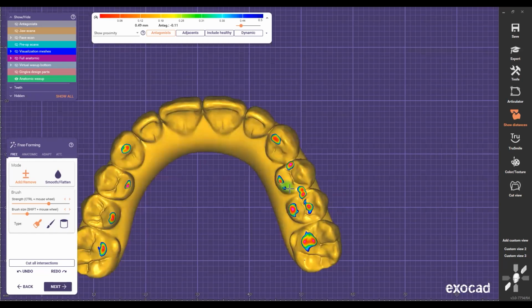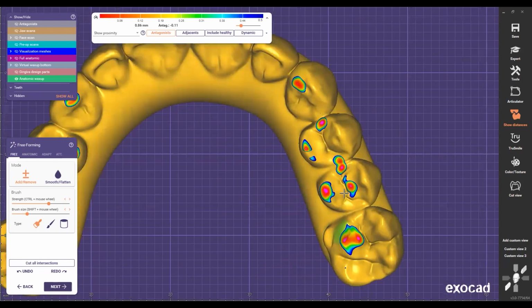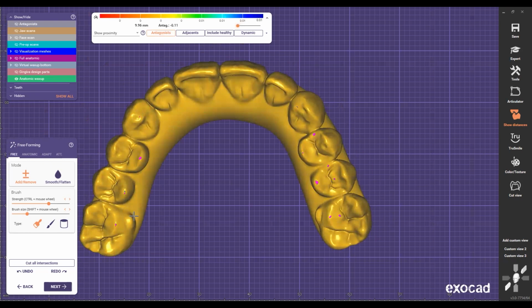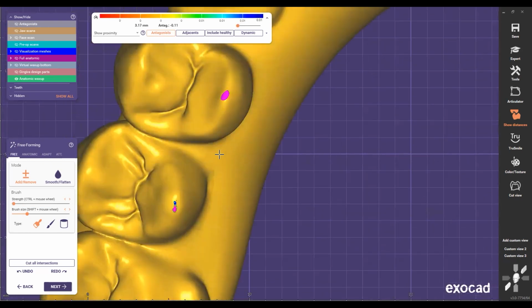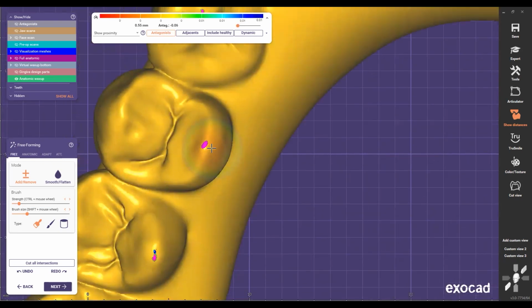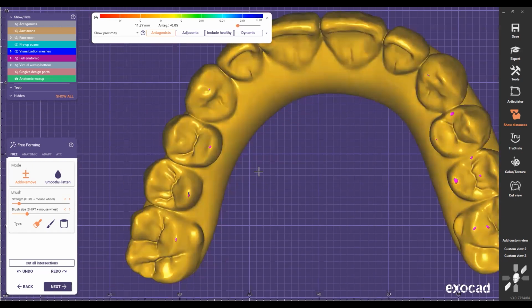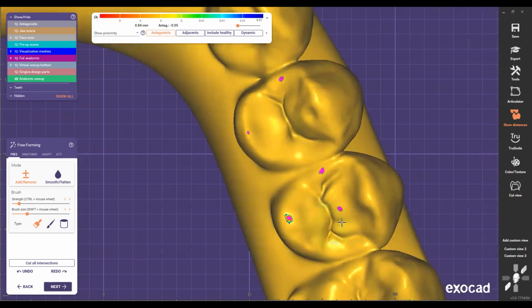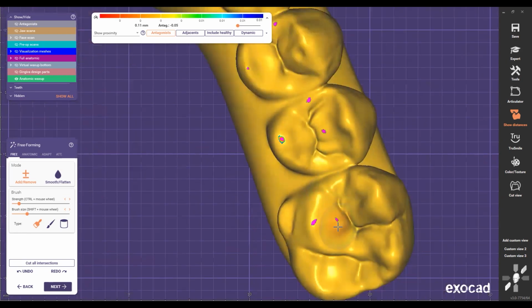So then once I do this, I can just come and say, okay, now I'm gonna bring everything to zero. I'm gonna bring these contact points to zero, to just a small point, small point, small point, because I don't want to adapt yet, otherwise I'm gonna have a ding right there, and I don't want that.